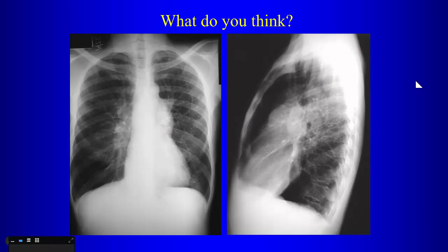So what's abnormal on this chest radiograph? Pulmonary. Would you say prominent, or would you use some stronger terminology here? Dilated. Yeah, so what's dilated? Pulmonary artery. So this guy here is what? Pulmonary artery. Yeah, it's the main pulmonary artery, and that's pretty massively dilated. This guy over here is the right pulmonary artery, so those guys are pretty big.